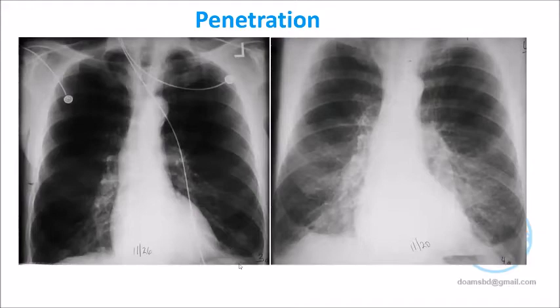May I request one, Dr. Rashid, be with me, please? Just a volunteer. Can you see any vertebral body through the heart shadow here? Though it is difficult. Dr. Hind also, can you see the vertebra through the heart shadow that is here? Yes, sir. And here? No. So this is the standard penetration, when the vertebrae are visible through the heart shadow with difficulty. But very clearly visible is also bad. Not visible is also bad. This is the penetration. Remember it.